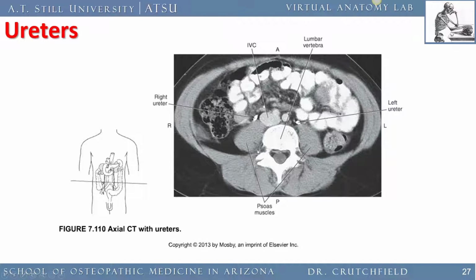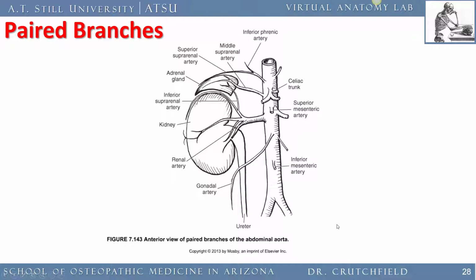Find the psoas muscle, and directly on top of it, usually you'll find the ureter. So here is aorta, here is inferior vena cava, and then we see contrast all within the small intestine. Here is ascending colon, and I'm not sure what this fuzz is here.